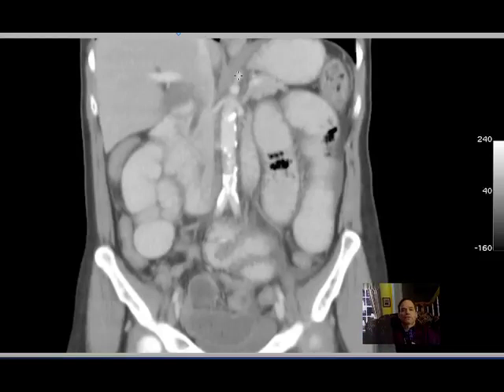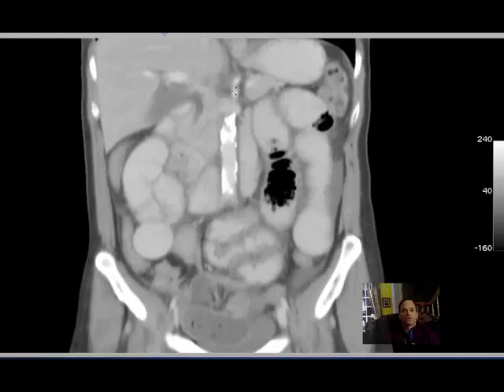Left gastric is the one that kind of hooks up and then curves along the lesser curvature of the stomach. This would be then the superior mesenteric artery. Let's see if that's true. We'll go out a little farther. Surely enough, it is surrounded by fat.